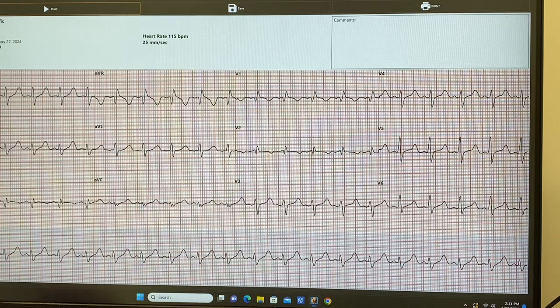That's an S. So there are two negative waves, Q and S. It's positive, negative, positive, negative, positive: P positive, Q negative, R positive, S negative, T positive. That's the pattern. So it's normal for it to be negative. It's a little widened, but that's not a thing. Only the QRS width is what's important.